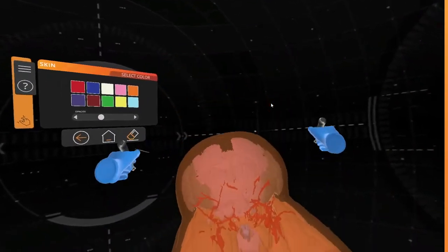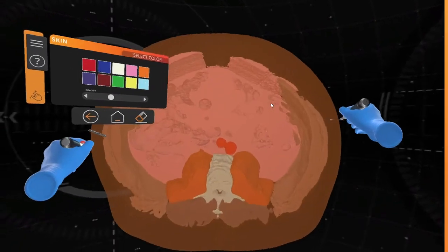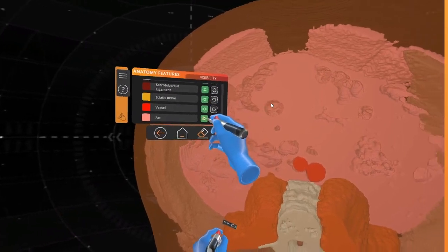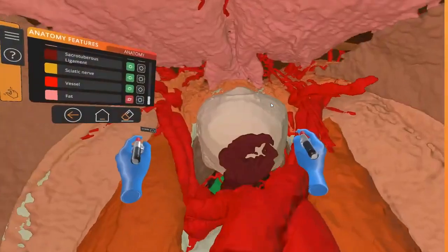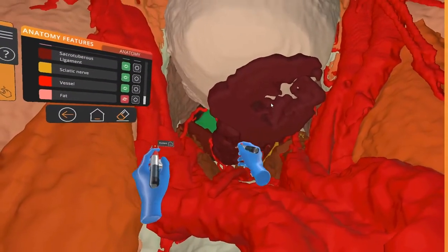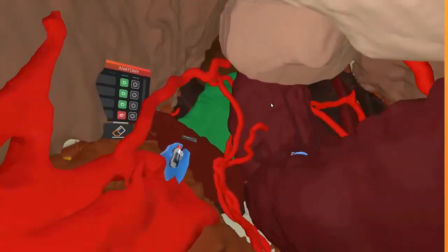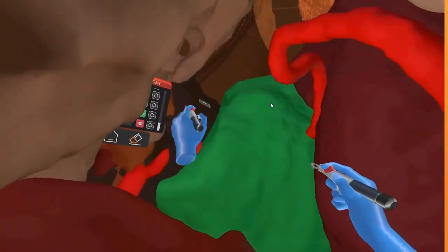Placing the patient in the supine position, we begin our exploration of the patient's internal anatomy. Here, we remove the visceral fat to optimize visualization of the pelvis. The user is able to navigate through the patient's body in 3 dimensions using intuitive hand gestures. The mass is seen shaded in green and centered within the posterior perianal region.